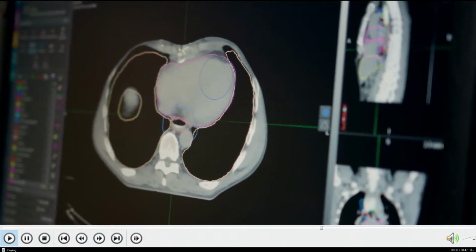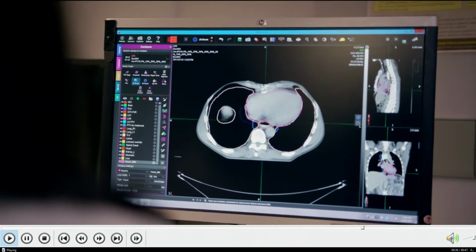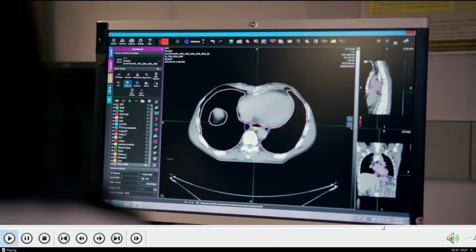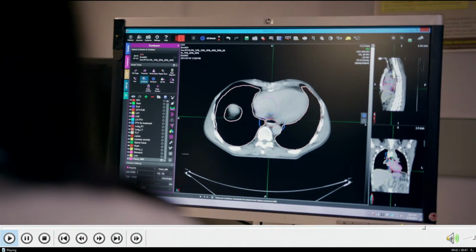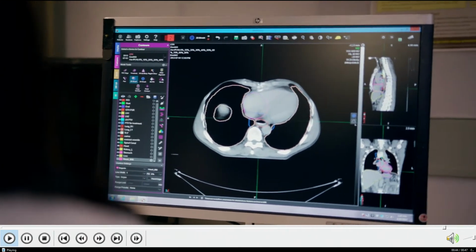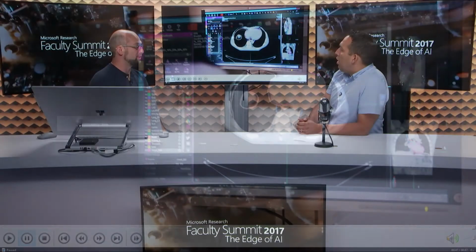So you can see that basically it's a very primitive tool. You just draw outlines, right? And then you switch to the next slice and you draw another outline. So, a medical image is multiple slices taken one after another. And that could be like 300 slices or 200 slices. It's a very manual, very laborious process. And we built a tool that helps save time, that takes this process from between 30 and 40 minutes down to 5. And this is interesting, right?